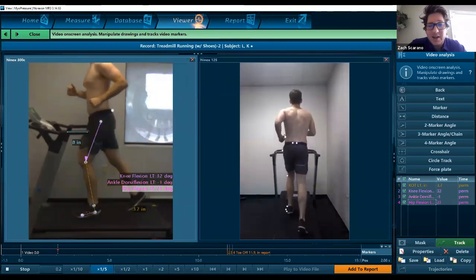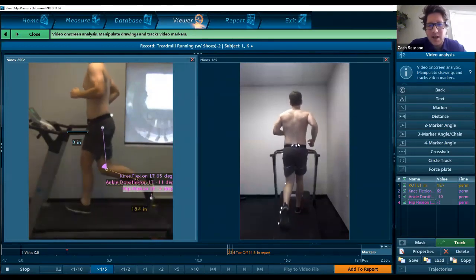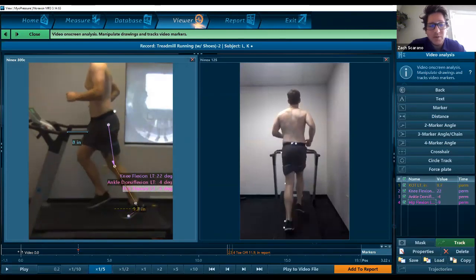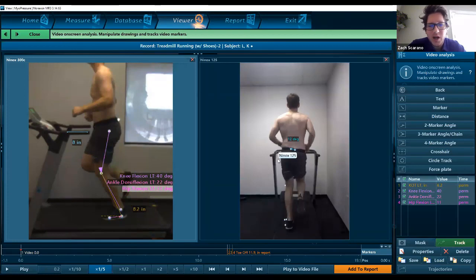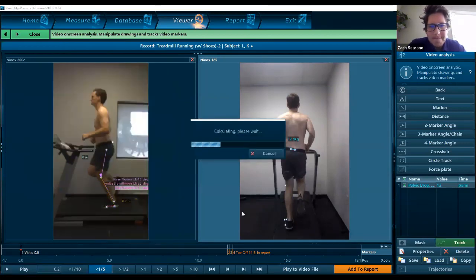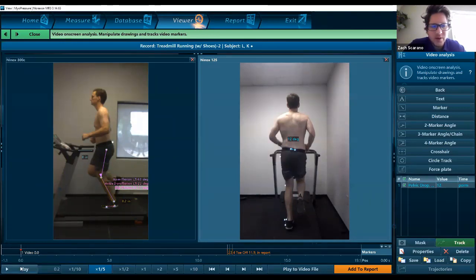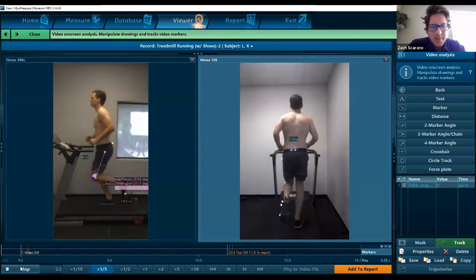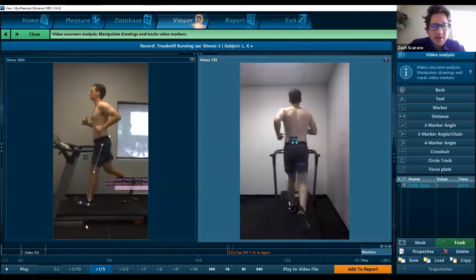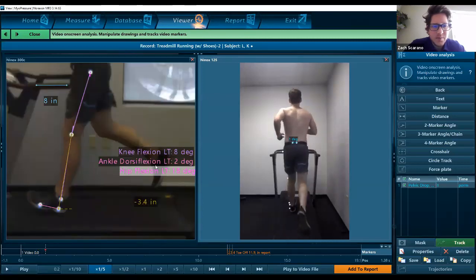As you saw, I did not track the posterior video yet. So we actually lost our pelvic drop marker because it simply appeared for a couple seconds as a still frame drawing and then went away. So let's go ahead and track that real quick. And then you'll be able to see that with the 2 video views, we're able to track both of those. So now we've got this showing in the video. Again, this is something where you've got the control to move these things around.